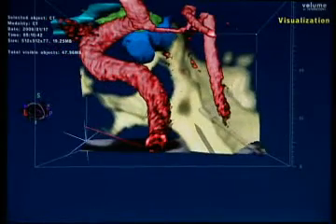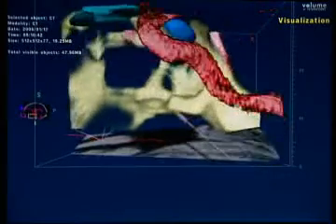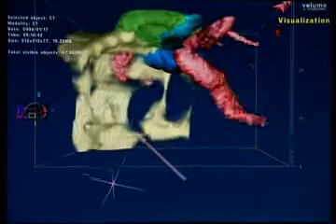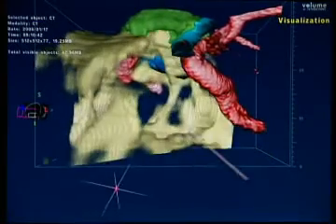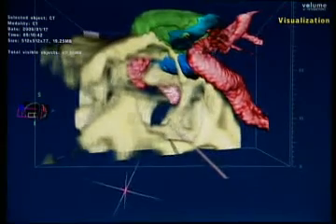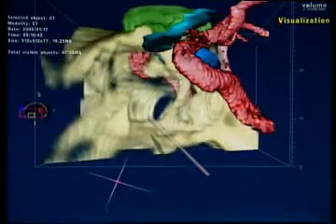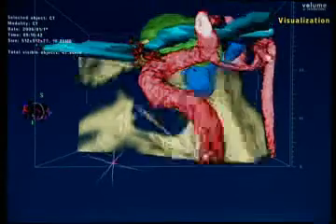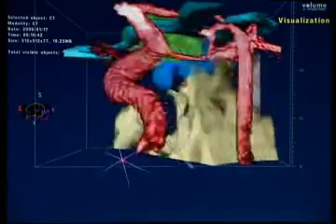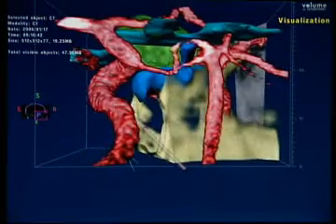So I cropped the skull base sagittally. Now you can see this is the relationship, right? The skull base coming in, the lesion sitting right there at the planum, at the tuberculum, and extending down into the pituitary fossa. So you see nicely the pituitary stalk.